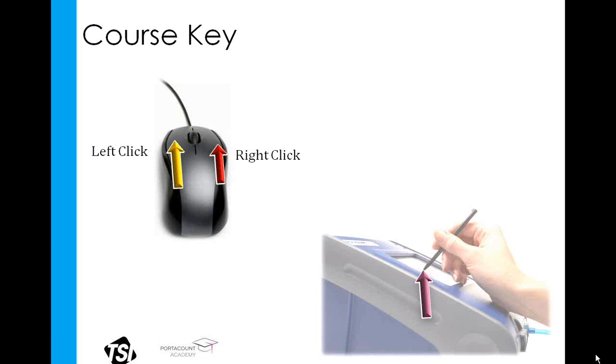I will forewarn you that many of the screen captures of computers in this presentation are based off of Windows 7. But for those of you running Windows XP or Vista, you should see something slightly different, but it should be for the most part similar. Also, for the remainder of the presentation, I will refer to the PortaCount Pro Model 8030 and PortaCount Pro Plus Model 8038 as simply the PortaCount Pro. So unless I specifically refer to one model or the other, you can just assume that I'm referring to both.